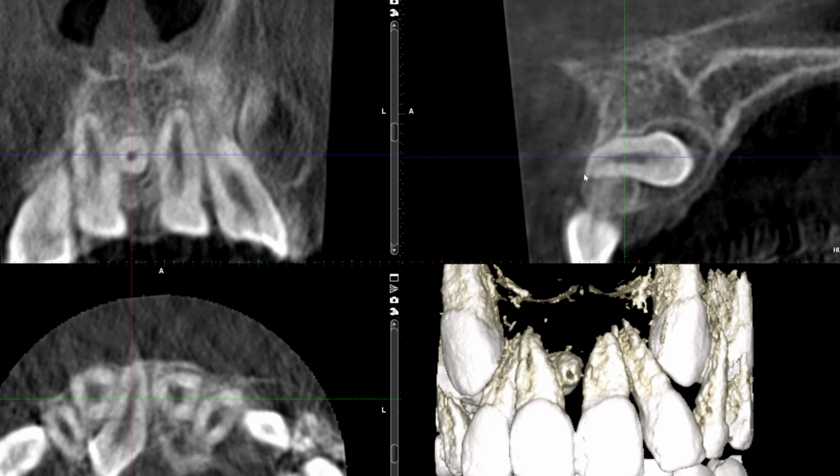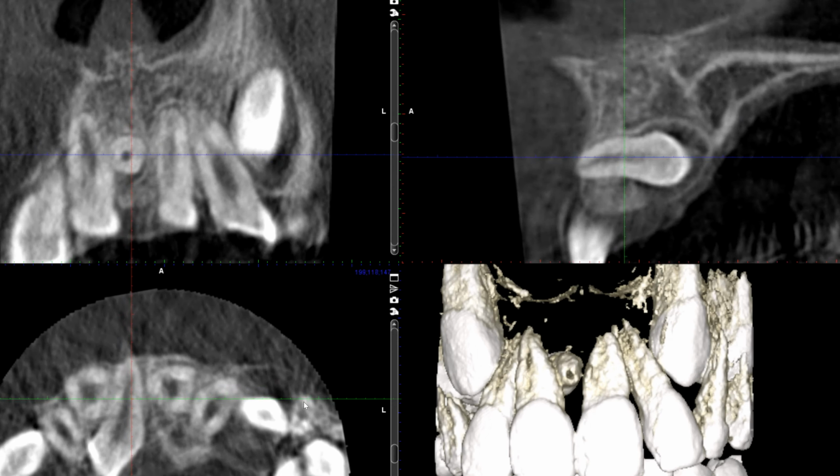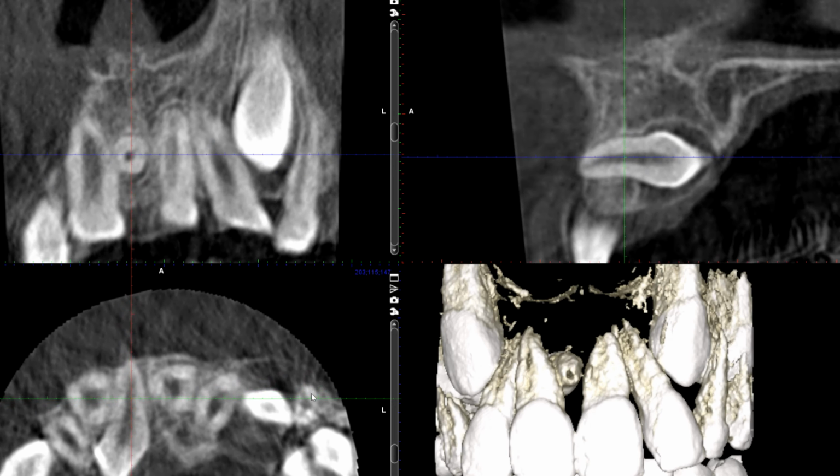And also we can see that the root length is limited by the alveolar process and the buccal cortex, and there's a very thin buccal cortex, if there's any, and you can sort of see the shape of the root that's been somewhat perhaps dilacerated or developed to accommodate the normal anatomy of the alveolar process. So yes, very interesting, right? Hopefully this was another interesting case for you to learn.